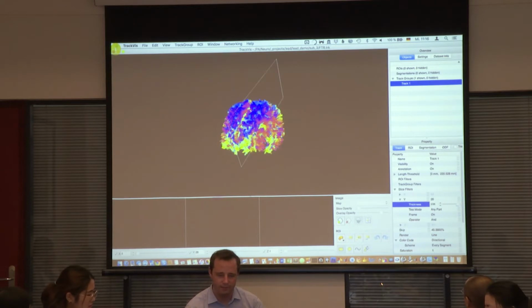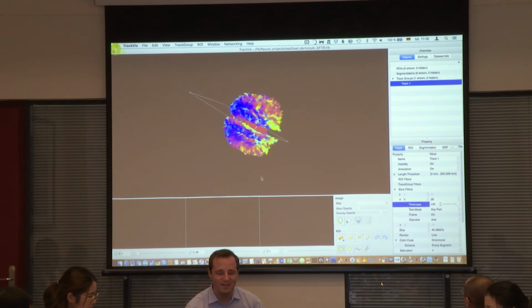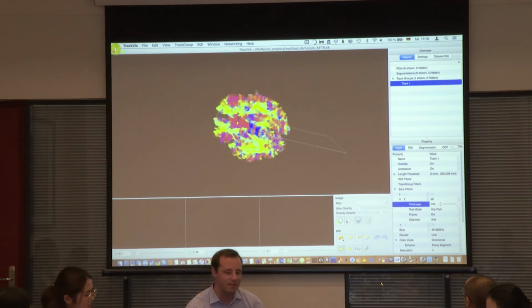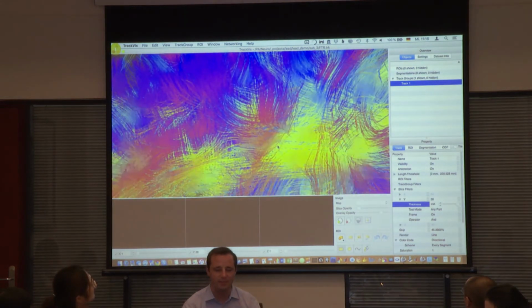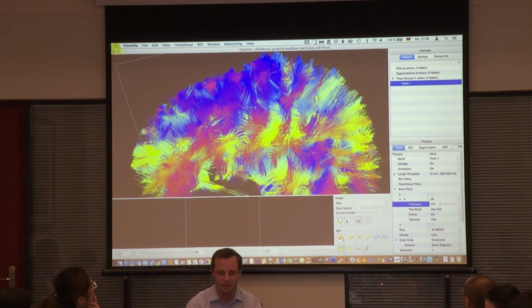Okay, so we have these tracks. As you can see, we sometimes have problems converting to TrackVis format in a proper way. It works pretty well for the MNI space, but somehow not in native space. But you can still look at whether the tracks make sense at least. This is so weird.